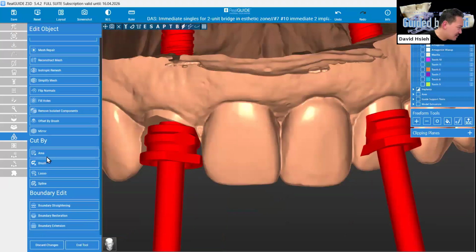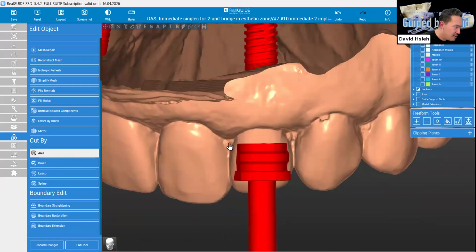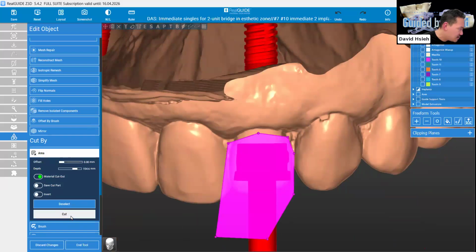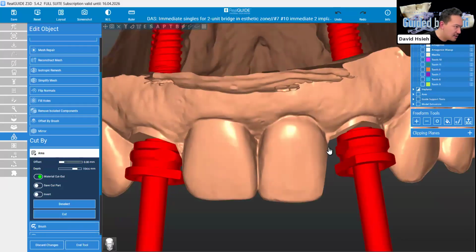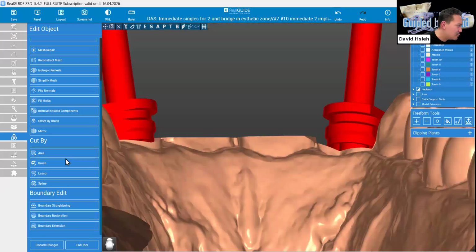Because all the teeth are going to be extracted, four of them, right? For the surgery, we can ask the surgeon, hey, maybe just take out those two first. Or if you want them to take them all out, that's also doable. Just do your thing here, and then they'll just cut and close the loop.